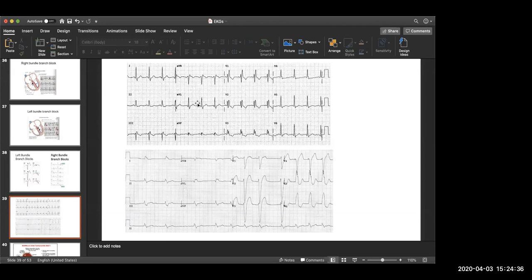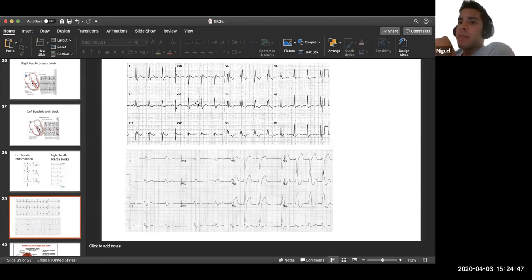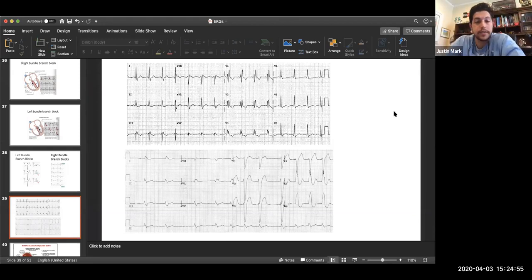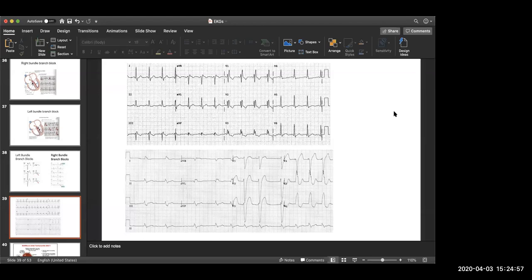but you don't see any activity. So that means it's not moving downwards. So you look at where it is moving towards, which way is positive. You see AVL is positive, that means it's moving to the left. V5 and 6 are also positive, so it's more confirmation about the left. And 5 and 6 is for the left too, so it all makes sense. I'm glad you did that actually. I just had that epiphany moment right now.